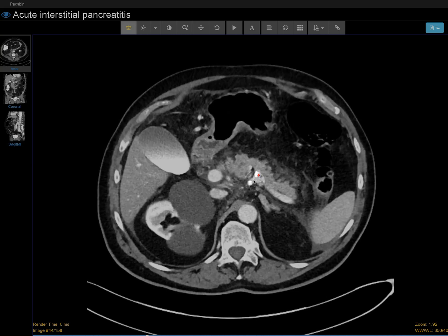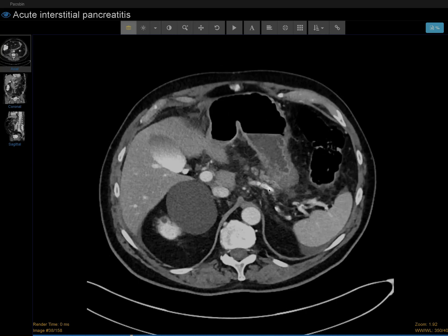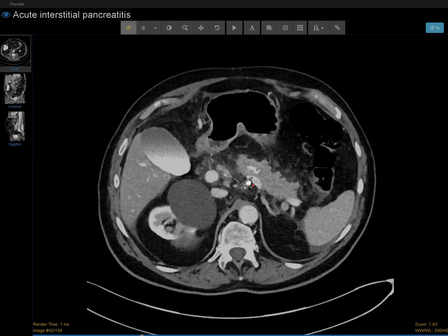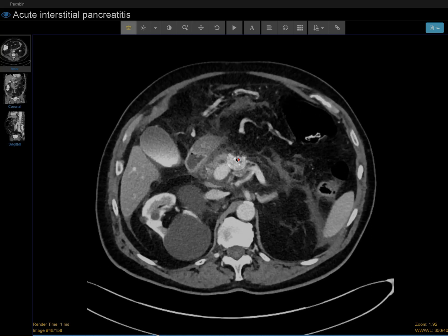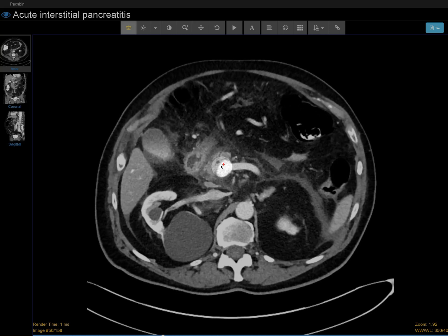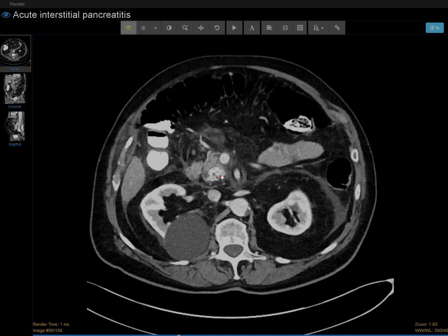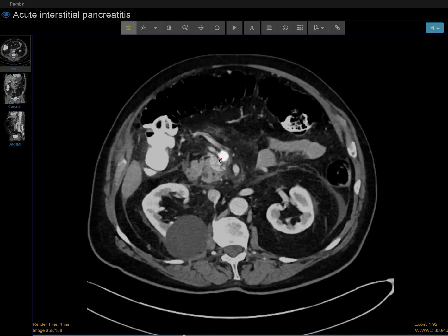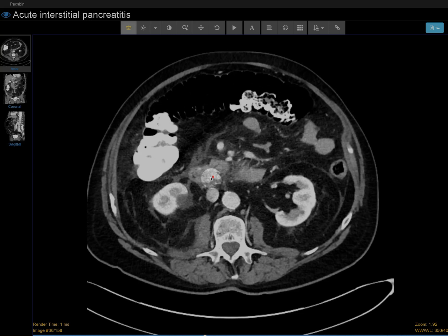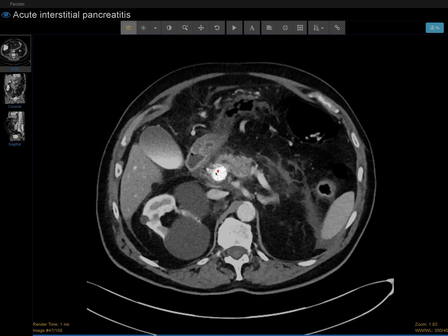All this area seems to be enhancing pretty uniformly. There's our splenic artery, calcification in the splenic artery. Right here, as you can see, that's the splenic artery, and we have calcifications there. But as I'm following the pancreas, the duct is slightly prominent, but I think up to 1.5 millimeters is reported to be okay. This probably is borderline. And even when I come down here, I think all of the pancreas is enhancing relatively evenly, so I didn't see any areas of necrosis.